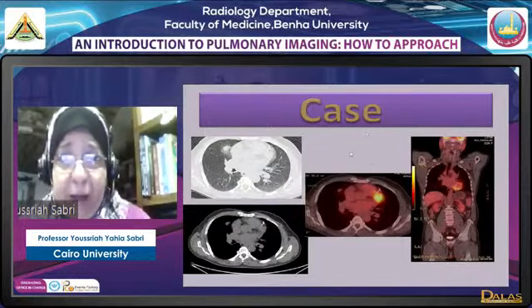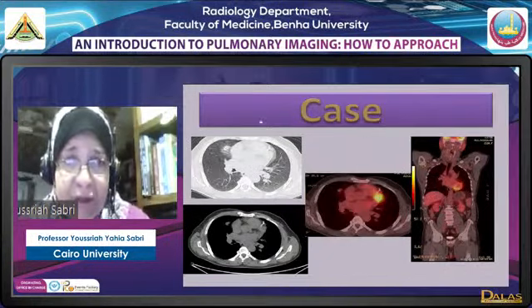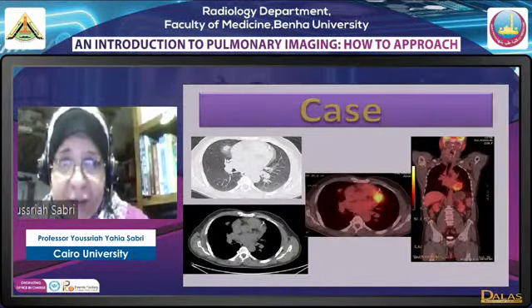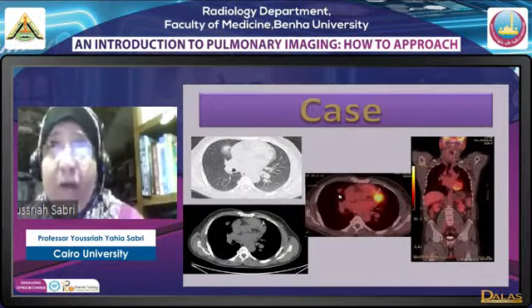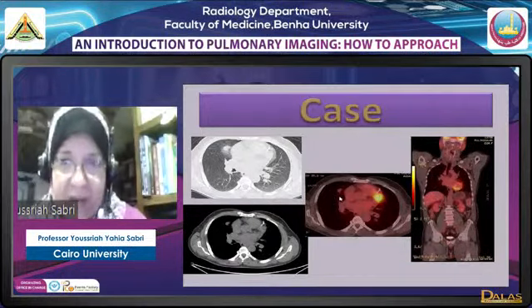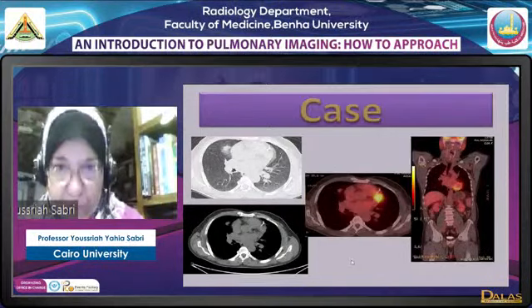No uptake means scarring. No, this is not the appearance of scarring, but there is a lesion, subsolid, which didn't take any tracer in the PET CT. This is very suggestive of adenocarcinoma in situ, and the case was proved to be an adenocarcinoma in situ.